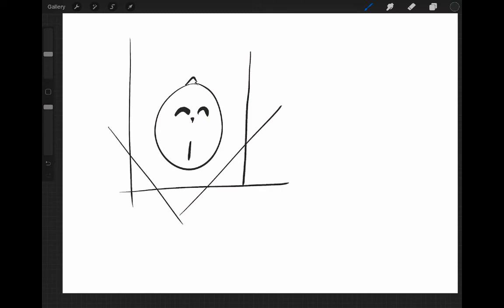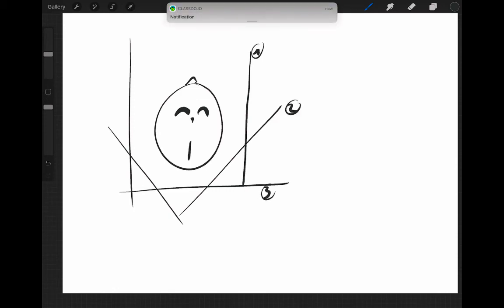And if you look at the first projection, the second, the third, the fourth, and the fifth in sequence, it's as if you're stepping around the head and seeing these projections in 3D, and it becomes very easy to tell apart what the 3D structure is, okay? So that's a perceptual consequence of how our visual system works, okay?